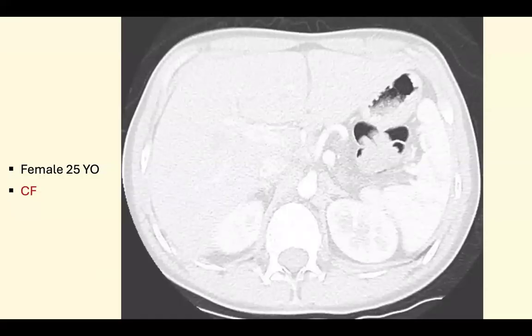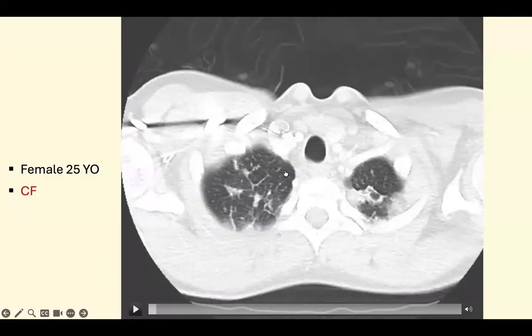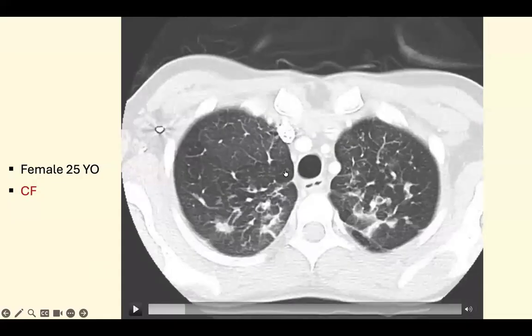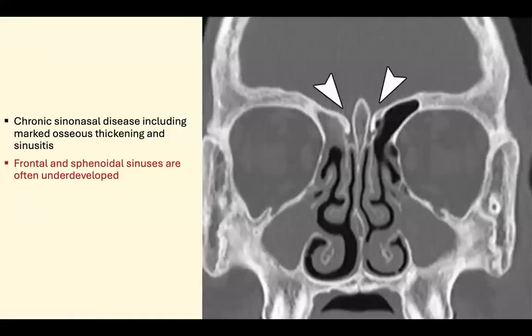So we have not only to be descriptive, there is bronchiectasis, but also mucus plugging. So we should alarm that there is a possibility of an underlying systemic condition, cystic fibrosis, if in the upper lobes, if it is not known clinically or mentioned in the request. There is another case. We saw this case already. Let's proceed. I saw this image.